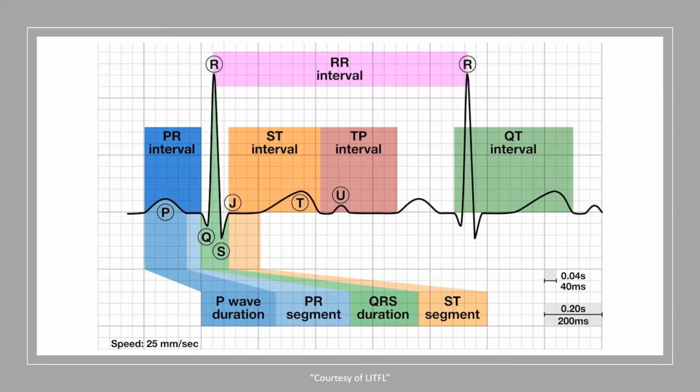So let's quickly, for our beginners, cover these parts from the ECG. Let's start from the beginning. We have here the P waves, followed by the QRS, and then the T wave and the U wave. What I want you to notice is, let's just highlight some stuff. So this is our P wave. The beginning of the P is here.